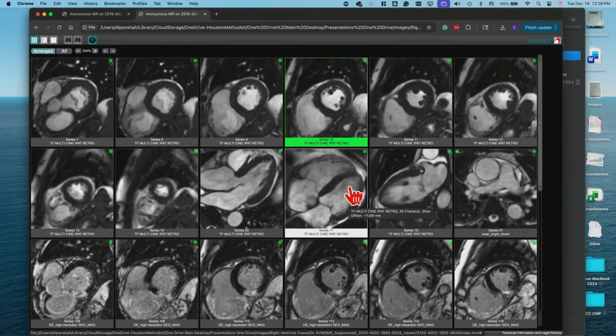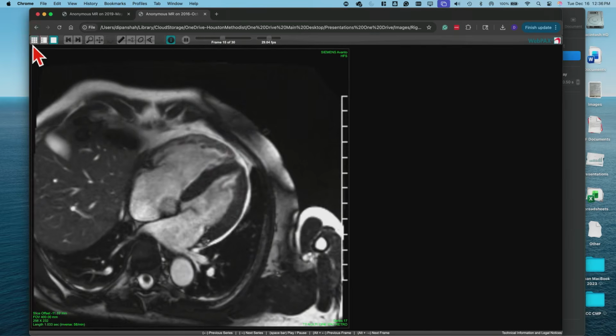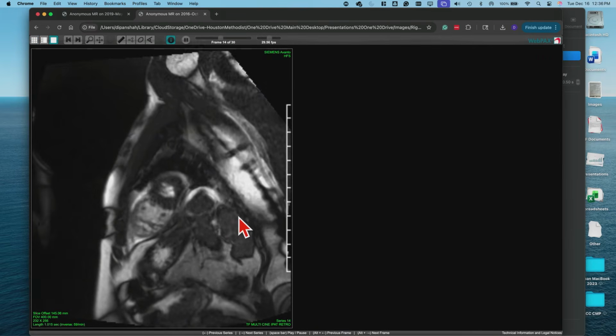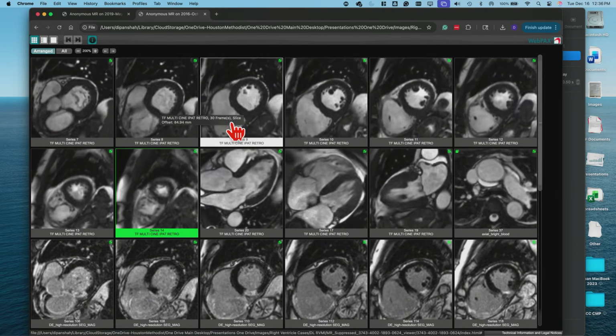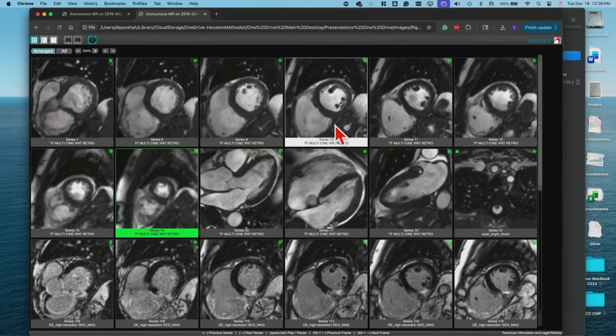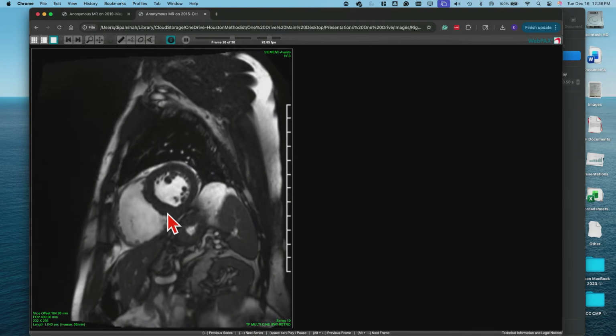Yeah, this one I'd be careful about, because again, you may be foreshortening a little bit. Because if you look at the short axis view down at the apex, how does it look? Okay. Yeah, it doesn't look abnormal. And then if you look at it from a regional standpoint, look at the top half of the heart, look at the bottom half of the heart, does it look like there's a little bit of a difference? Yeah, so this area right here, right? It's subtle, but I would probably agree with you that the infraseptum, inferior wall maybe is not as good as the anterior wall, right?